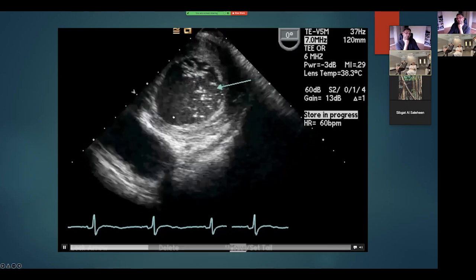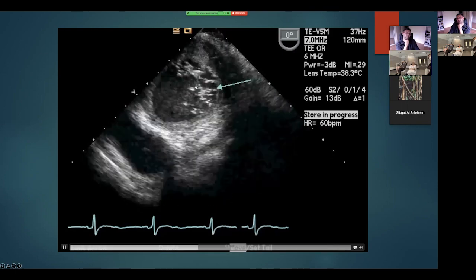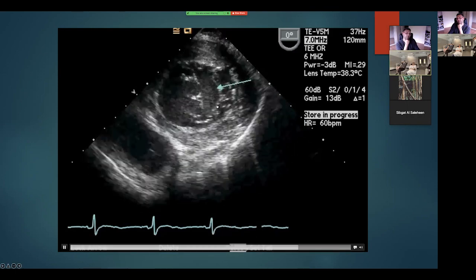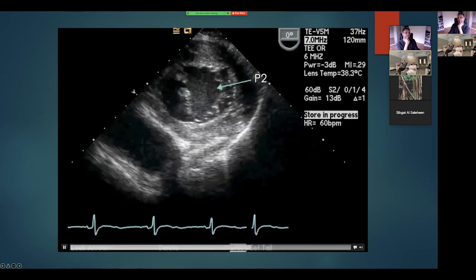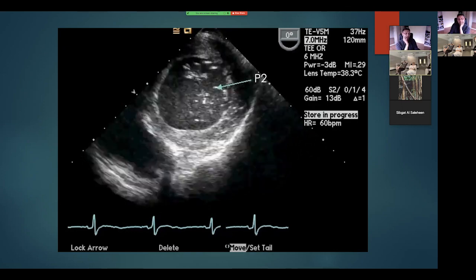So this is anterior, as I mentioned before, and you mentioned, bigger one anterior, smaller one posterior, and it's in the dead center, in the center. So P2. Nice.